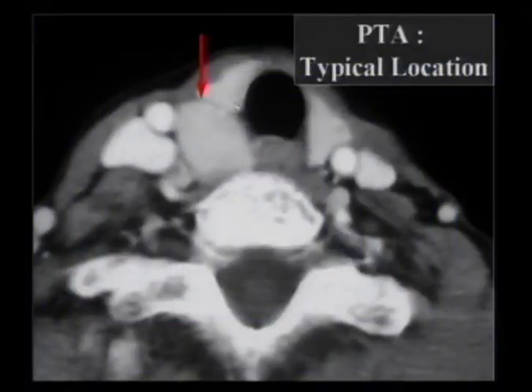This is a pretty typical case of parathyroid adenoma, what they look like on imaging. Most people are not undergoing CT, although some people will talk about multiphase CT for this diagnosis. Usually it's a high-resolution ultrasound diagnosis where a patient presents with hypercalcemia, and the surgeon asks for an ultrasound just to see which side it's on, and then they go explore the side that you find the nodule on. They don't really care if it's a parathyroid adenoma you found, they just want to know what side's abnormal. They explore that side and take out 2 of the parathyroid glands. That's one way that a lot of people approach it. If the patient still has recurrent or persistent hyperparathyroidism after surgery, then you go hunting for the ectopic glands.